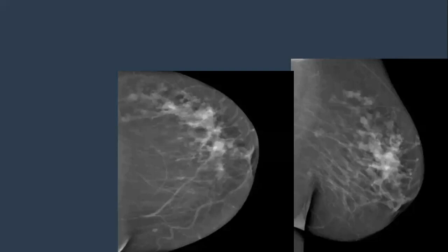And even if you look here, obviously there is increased vascularity along with distortion and a band-like structure going toward the nipple with nipple retraction. So what is next? Ultrasound. Yes. The ultrasound findings were inconclusive. Then if we have MRI, we can do MRI.